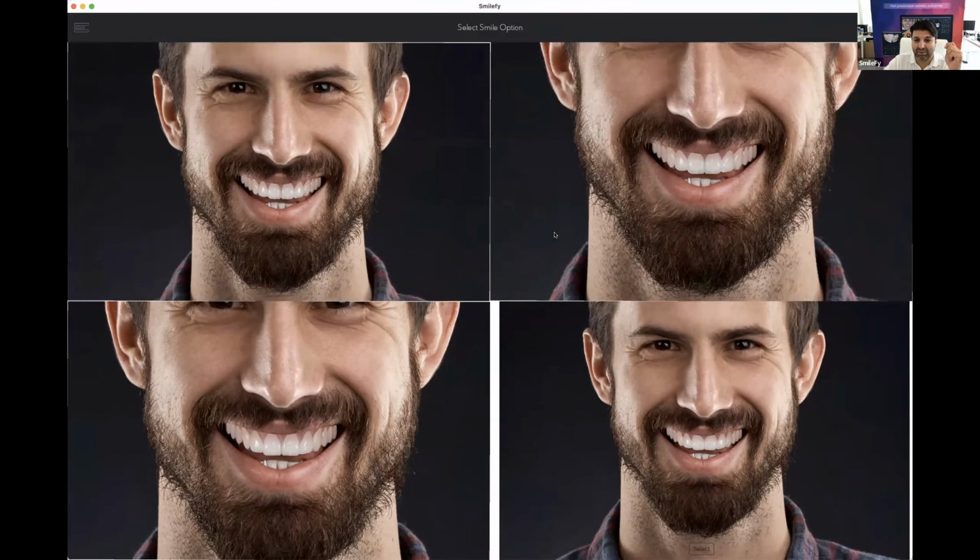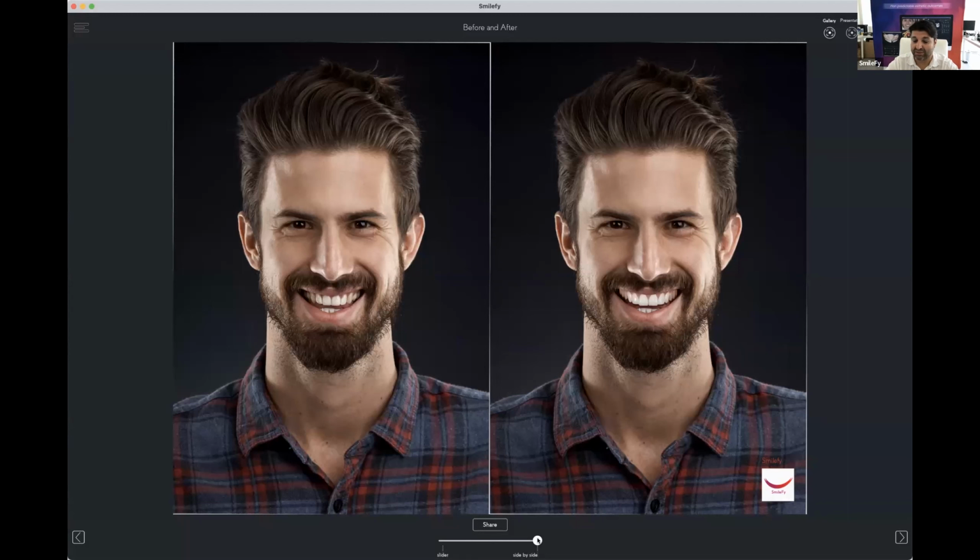So the smile, the motivation of the patient, seeing the advantage of an aesthetic treatment and giving us some important information like the dominance of the smile, the form of the shapes is one of the most interesting and important aspects of the discussion to motivate the patient to go to the next step. So that's the big change in the smile simulation. We do have 4 results, and I think that's going to be very, very powerful visual communication.